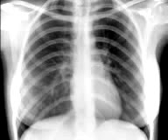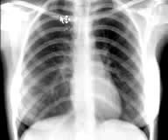Both lungs have good volume and are almost equal in size. Height of both diaphragms is at the level of 6th anterior rib or 9th posterior rib. If there's a good breathing effort, the lung will go a bit lower. So let us count the ribs. So this is first anterior rib, second anterior, third, fourth, fifth, and sixth anterior rib.